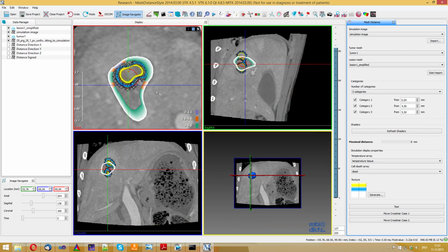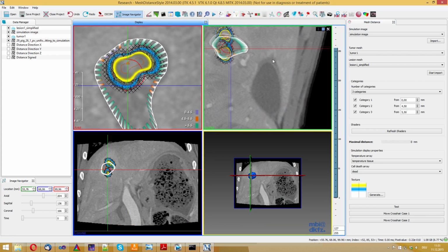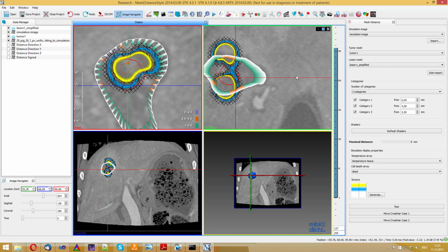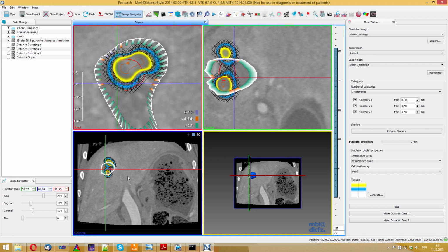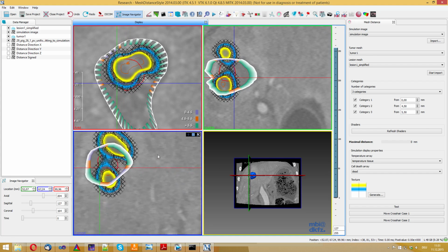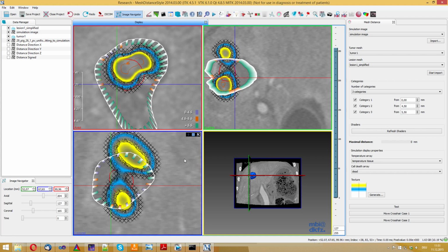The user can customize the appearance by picking the desired category borders and assigning a semi-transparent texture to it. Similar to the distance evaluation, we visualize the categories along the resulting ISO contours. We perform the formal evaluation with medical doctors in which we highlight issues with manual measurements. Additionally, we conducted structured interviews which show a preference of our evaluation method compared to the current clinical practice.